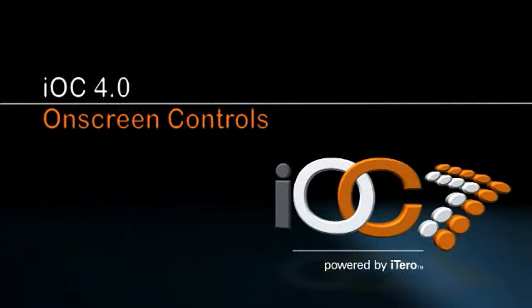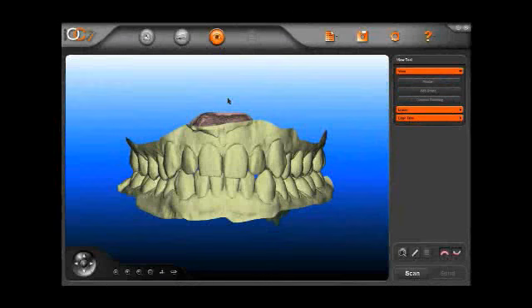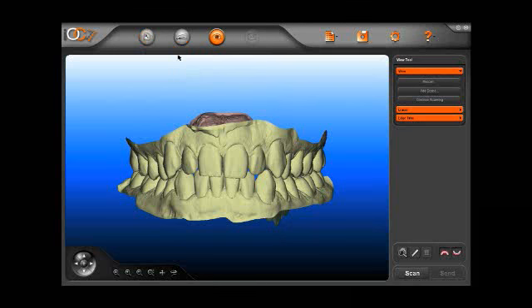iOC 4.0 has simplified graphic on-screen controls that make it easy to manage the scanning process and review treatment information. Let's review the user interface controls for iOC version 4.0. We'll begin with the treatment information, where the case details are entered and reviewed. The Scan button is used to pause or resume scanning. The View button is used for case review and analysis. The Send button enables the scan to be processed by Cadent or Invisalign.